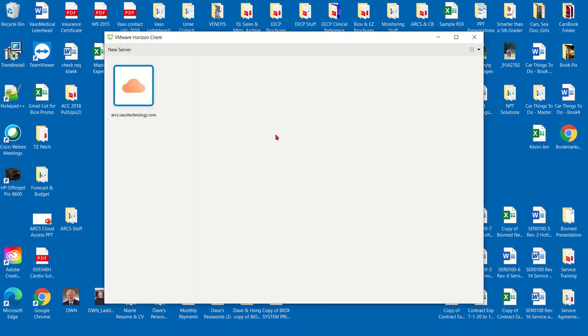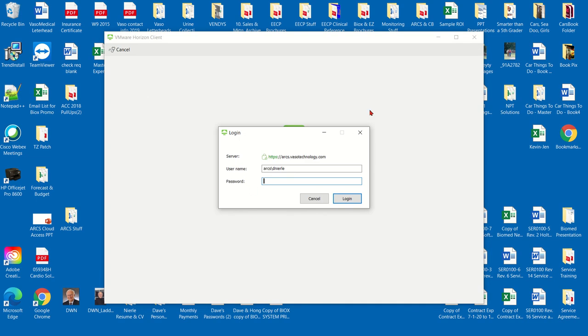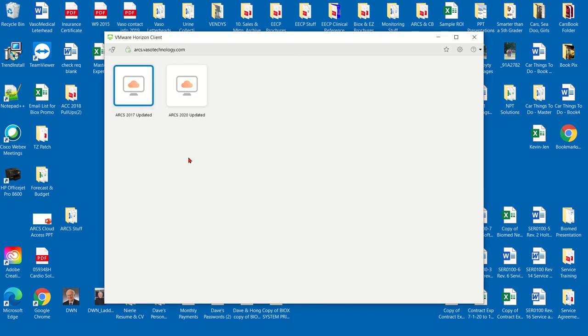It's going to take us a little different route to get to the cloud, but here again, you see something familiar, Vaso Technology. We're going to go there. We're going to sign in again using the same password. And again, this is going to take about a minute.